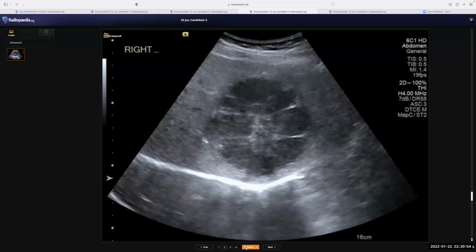So it is cystic in nature with multi-septated lesions, well-defined. This gives me the impression of a parasitic infestation like a hydatid cyst in the liver. I will convey these findings to the referring clinician to be discussed in the MDT, and will ask for a chest X-ray for this patient for the possibility of hydatid in the chest, and other cystic possibilities in the liver will also be discussed. What would you recommend next for this patient? I can ask for CT images, if possible, and a chest X-ray, of course.